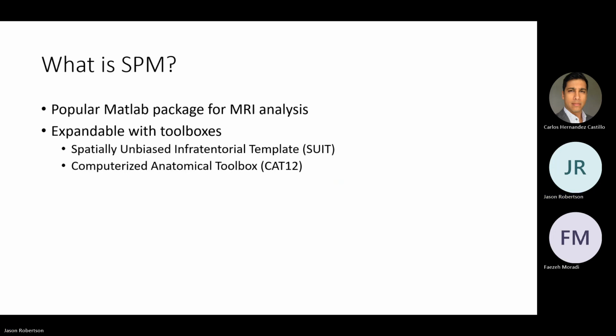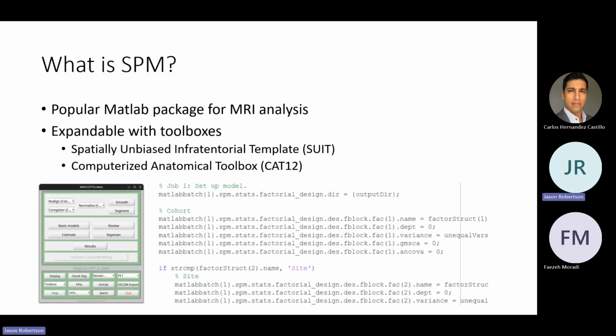And you can use this either with a GUI or with scripting. And the GUI can actually spit out the script for you if you want.